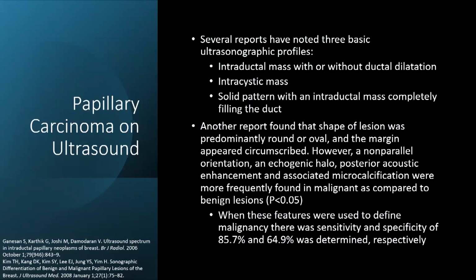So, if it's non-parallel, if there's an echogenic halo, posterior acoustic enhancement, or calcification, those are associated features that you may see with these papillary lesions, and that would signify more likely a malignancy versus a benign entity. These additional features can really increase the sensitivity and specificity of defining the papillary lesion with ultrasound.